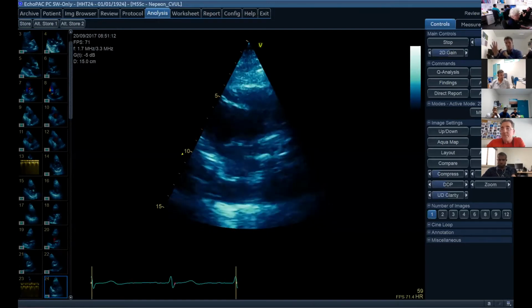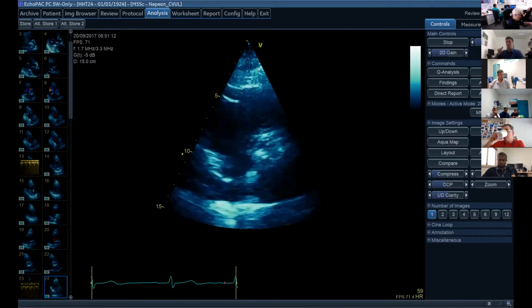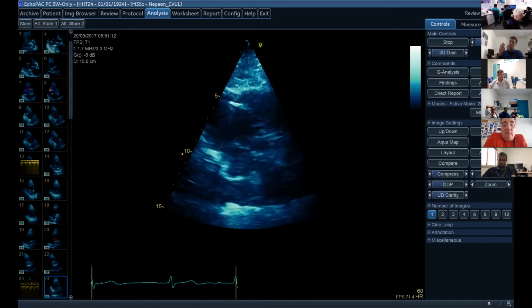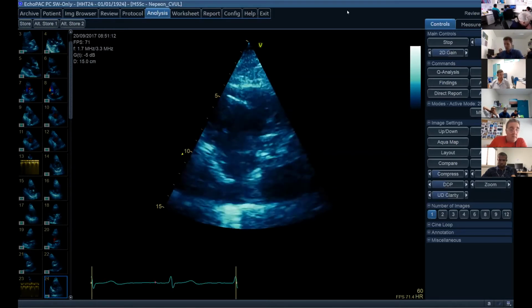With transthoracic, I'd argue you don't have good enough resolution of the image to be able to make accurate measurements. Yep. And with a bit of calcification, a few nodules everywhere, it can make it even harder. So I'm not suggesting we don't do it. I don't say you throw the whole thing out. I just suggest you've got to take that with a degree of caution. Cool? Yep. Nice.